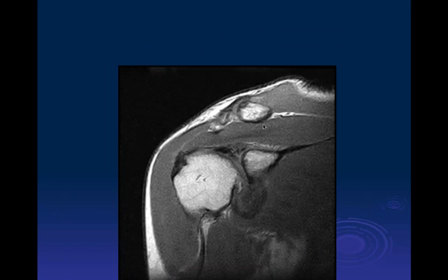Wow, interesting. And here's just another example where you can see the muscle extending very distally with a very small supraspinatus tendon. And you can see there's marked thickening of the muscle here. So this can be another cause of impingement. Uncommon, but something to be aware of.